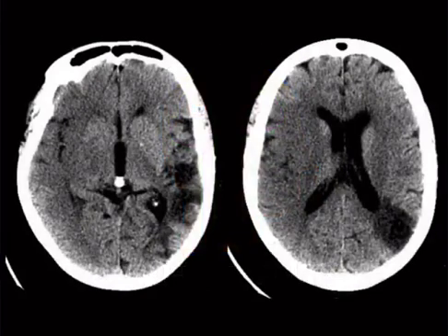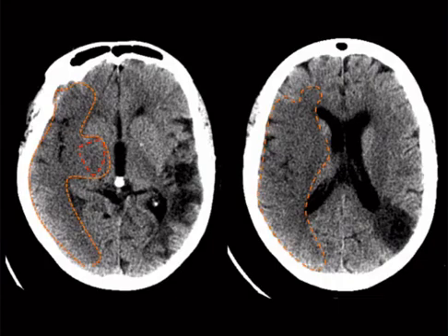Okay, so next case. Give you a second to look at it. All right, so you may have noticed that the basal ganglia is missing or disappeared, buzzword, on this side. Or you may have noticed that that whole MCA territory has loss of gray-white differentiation.